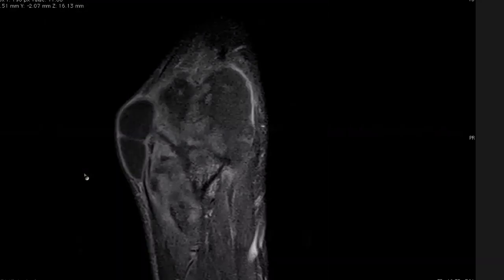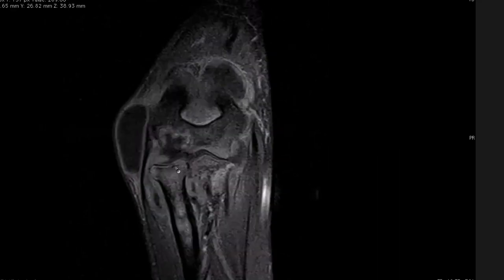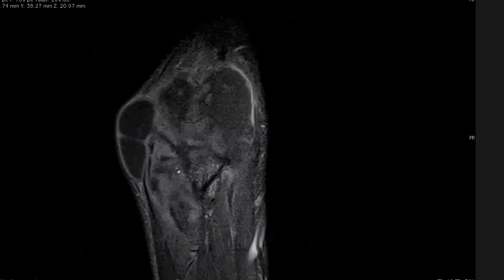And the last image I'm going to show you is the post-contrast image. You've got this collection, that's the sinus tract, and this is all enhancing synovium with osteomyelitis. So that's an ugly-looking process, usually TB, when you catch it this way. And these are just the lymph nodes there in the epitrochlear group. So TB can look like, there are a few similarities here, but important differences, I would say. Yeah. All right.